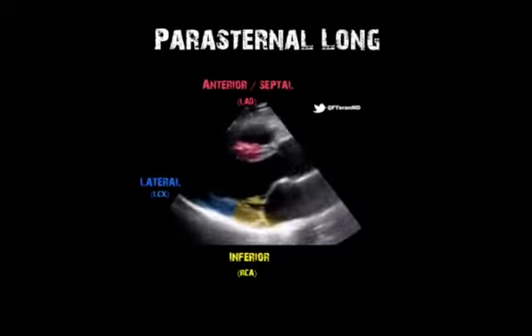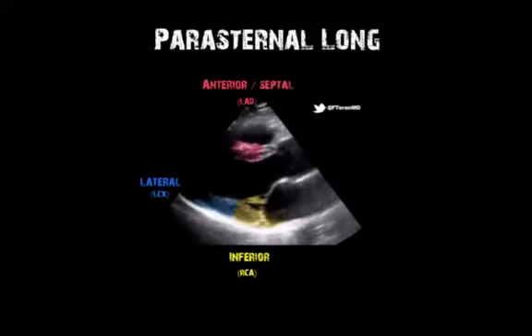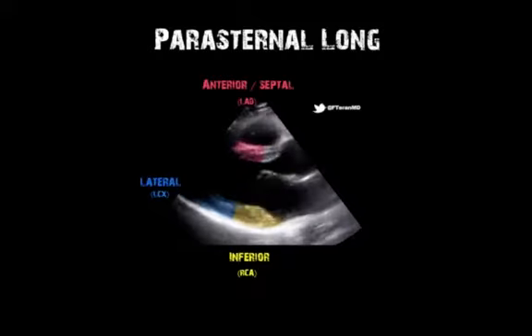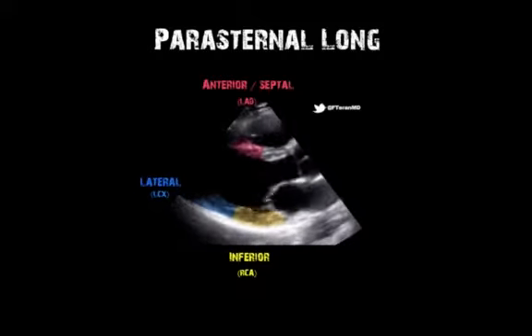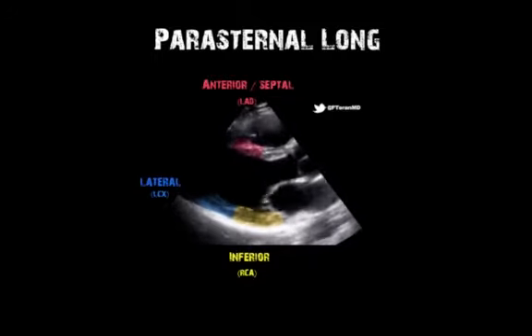On the top of the screen, we have the septal wall, which shares similar coronary distribution with most of the anterior wall, by the LAD, here in red. On the left side of the image, part of the lateral wall, irrigated mostly by the left circumflex. And finally, in yellow, in the center bottom, the inferior wall, largely fed by the RCA.